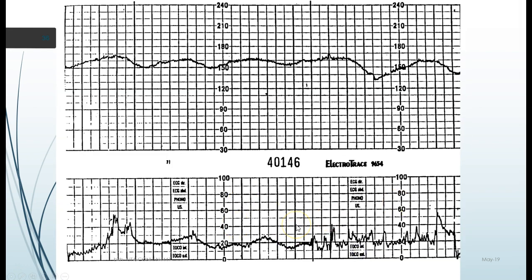But I can't tell you what the baseline here is. I can tell you this baby is in trouble though, because I can't determine a baseline. This baby's in trouble. So I'm going to be doing things like IV, O2, turn her, and hope if this doesn't get better immediately, I'm calling the provider to come see this woman. She will not stay on my unit looking like this more than about 5 minutes before I call somebody.